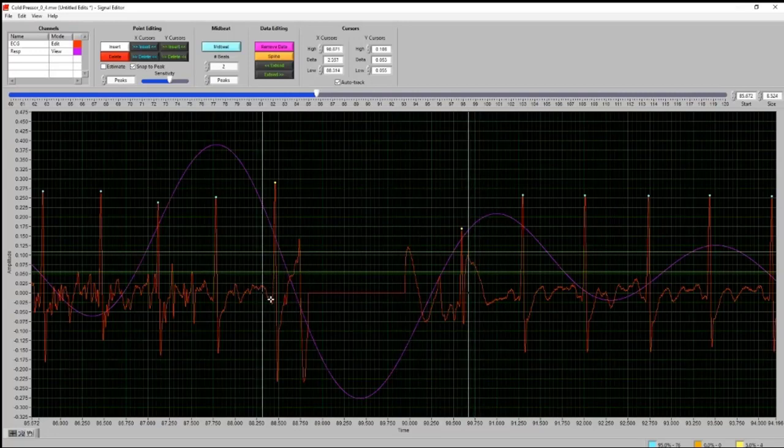Once again, I want to see good beats as my anchors: P, Q, R, S, actually some T wave there. It's a little distorted, but everything else looks great. And then same deal here. It's a little bit smaller, likely due to the motion artifact, which has nothing to do with anything else in most cases. But fundamentally, it looks like a good ECG beat, QRS complex. So we're going to place these X cursors on the outside, the outside being these yellow markers in this case, because before we place the midbeat, it thinks that's a very long beat, and so it's placing them as artifacts. Once we do that, we can actually see the algorithm is automatically identifying how many beats should be within there, based on the overall average for that segment, and then placing them there.